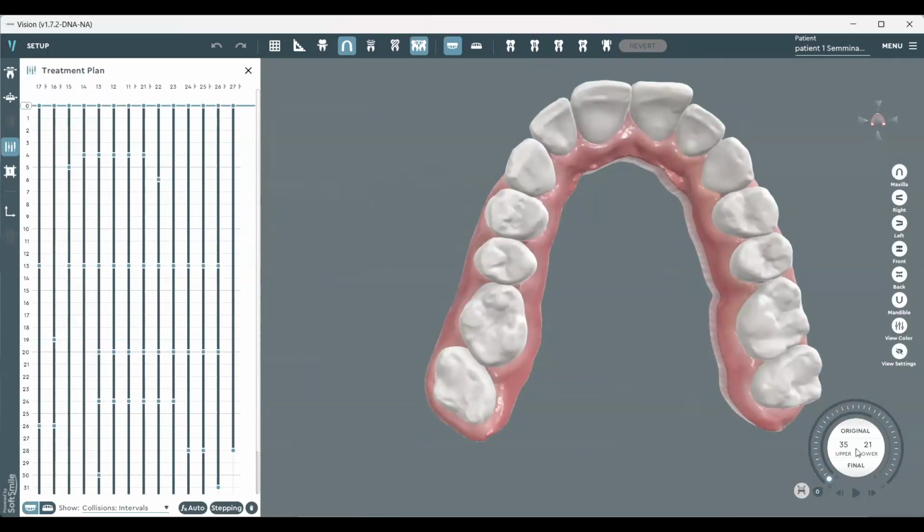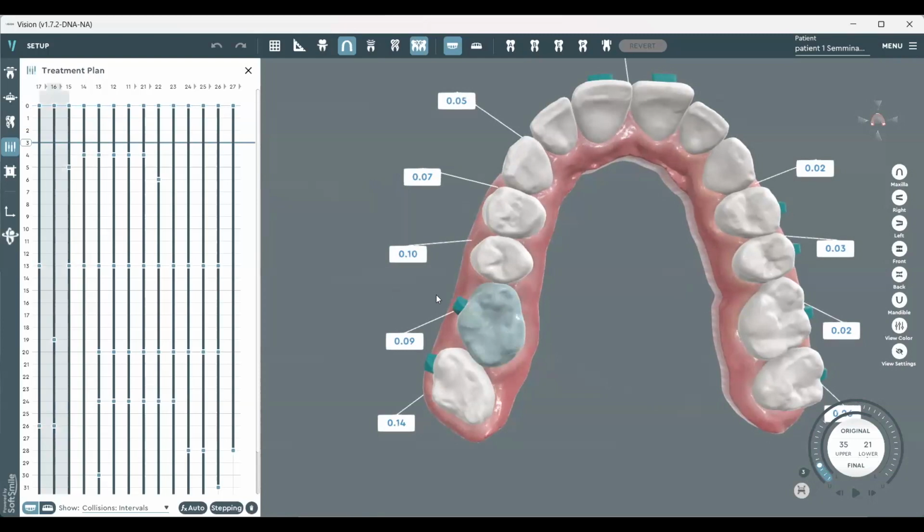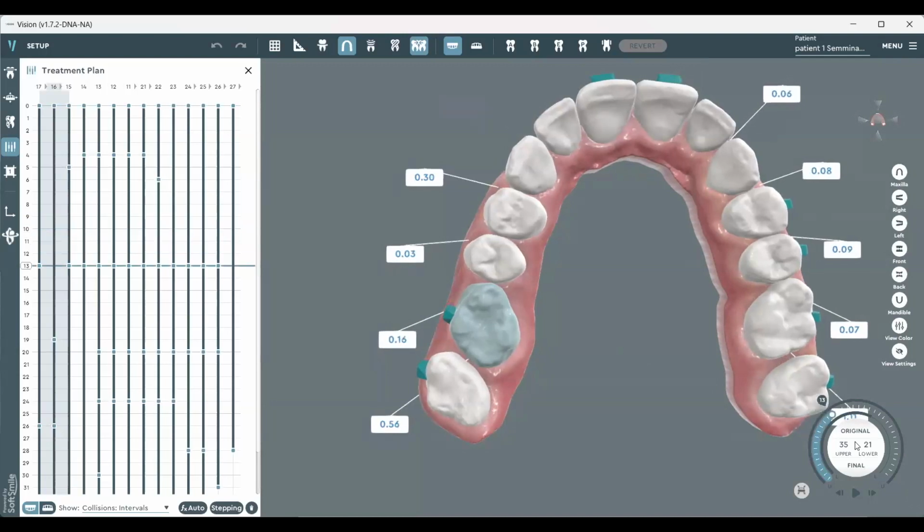So you can see the first step is going to expand premolars, but in this one, I'm going to do a mesial out rotation, leaving this part of the roots or this part of the crown also in the same position. This is going to give me more anchorage to make this rotation. So I'm going to move mesial out first. You can see there, the mesial out. This part remains in the same position. I'm doing expansion also in 7 and premolars when I'm doing the mesial out.